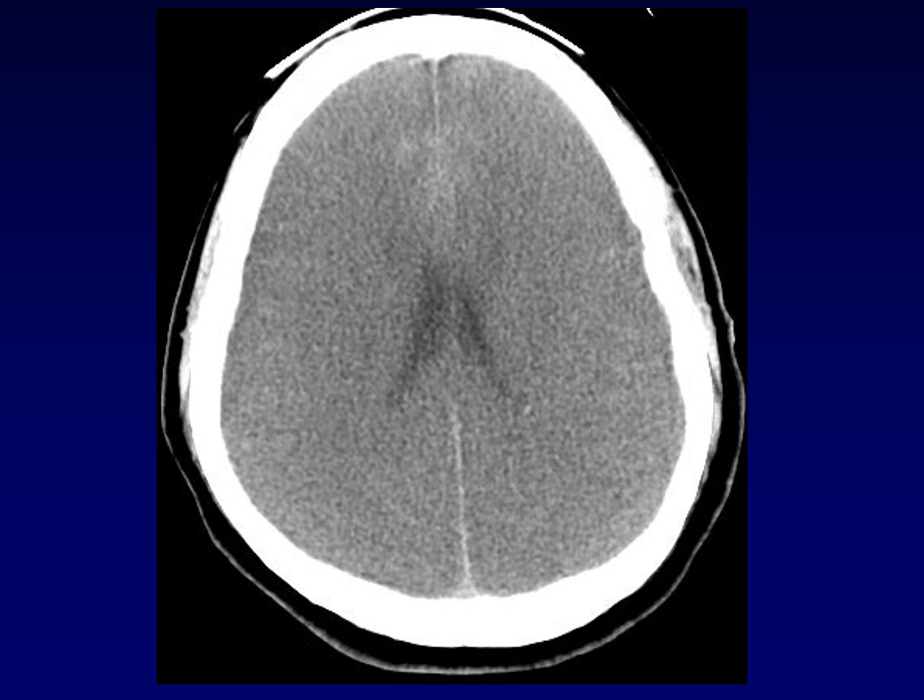So there's a couple things to notice here. One is that we talked about the difference between a 19-year-old brain and a 90-year-old brain. This 78-year-old guy should be a lot closer to the 90-year-old brain. He should have big ventricles and he should have large sulci. His sulci are completely inevident here. You can't see them at all. And his ventricles are really small, like that 19-year-old. That's not normal for a guy who's 78 years old.